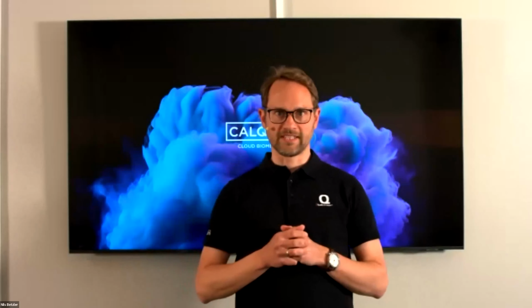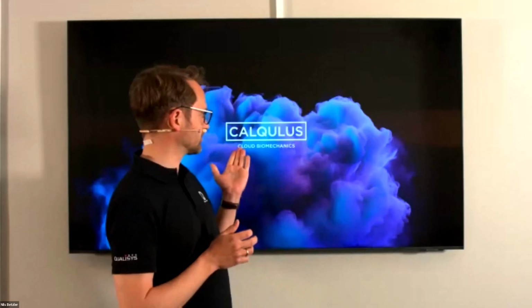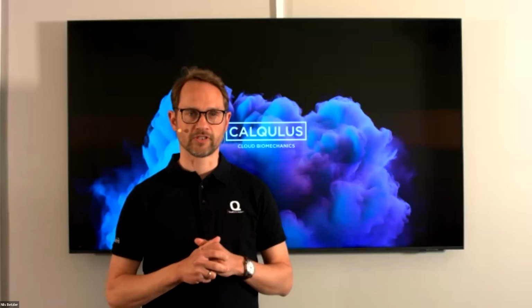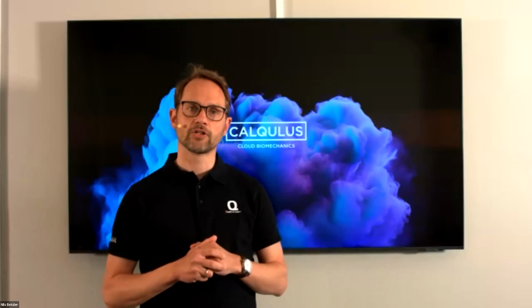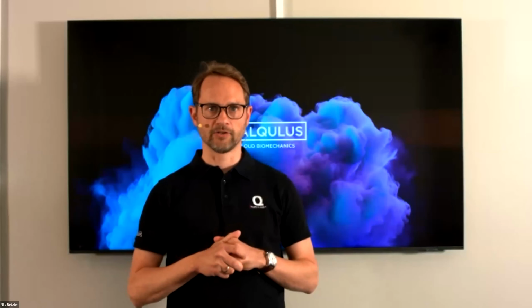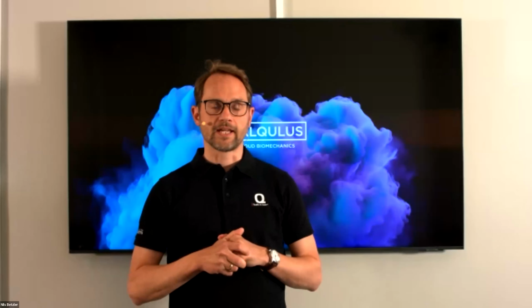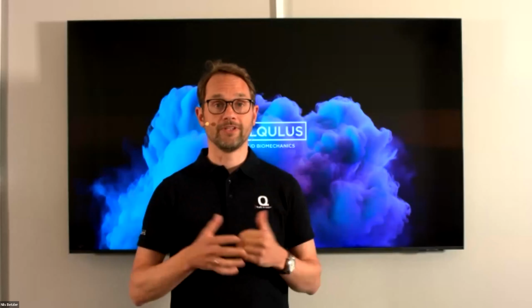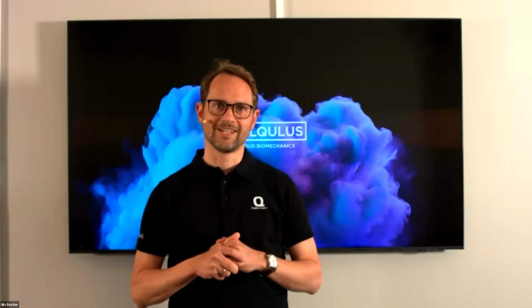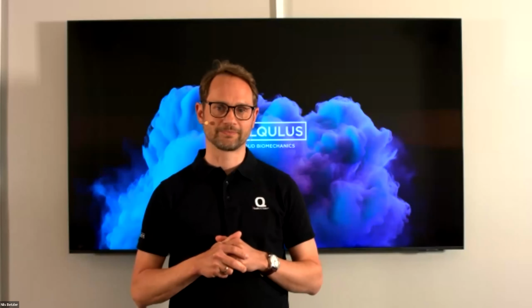The focus of today's session will be Calqulus, Cloud Biomechanics. We'll present you a full workflow, showing you from A to Z how to collect data and how to process it with Calqulus. And then we'll take a look under the hood to show you what is happening behind the scenes when you're running a cloud pipeline to process your data. At the end, we'll also show you how easily you can try it yourself so that you can just download it and see yourself how it works.